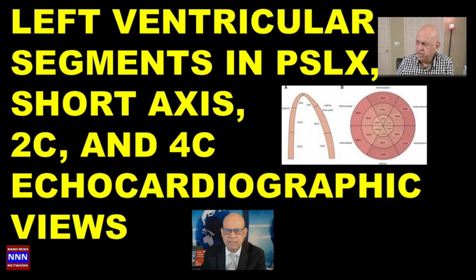So ladies and gentlemen, you have been watching a presentation on left ventricular segments in parasternal long axis, short axis, two-chamber and four-chamber view echocardiographic images, and how to recognize various segments, so you will be able to label which segment is involved in terms of paradoxical motion, which you can see in patients with pacemaker, or patients with left bundle branch block, or patients with heart surgery, or you see akinesis or dyskinesis, in fact, for those patients with possible aneurysm.